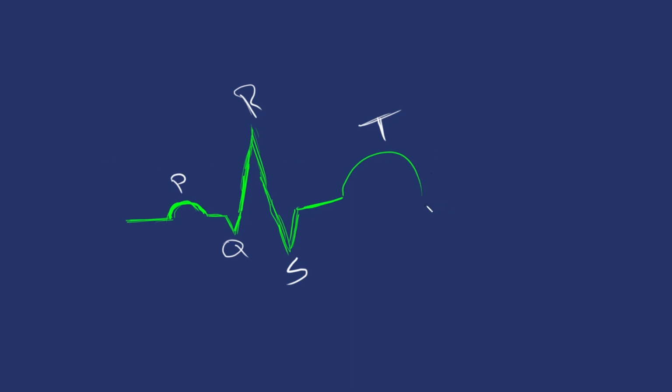And then sometimes you can have a U wave. We're not going to cover that in this video. That'll just be any kind of subsequent wave up over here. It'll usually be a bit smaller.